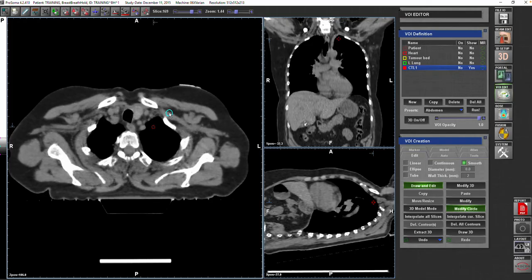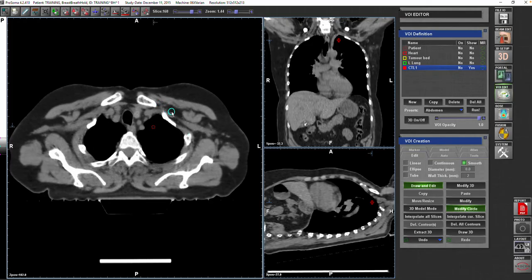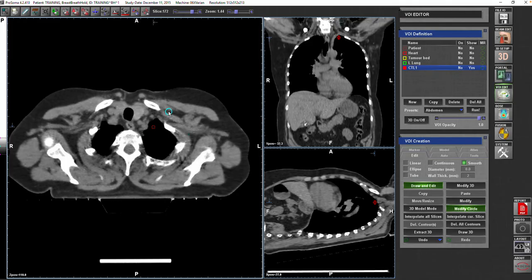It comes very thin, very strong, and very thick, so you don't know whether to take it or not. Usually we take it and cover the whole area, but some guidelines will do it like that. You should understand that this is the clavicular head of the pectoralis major muscle.